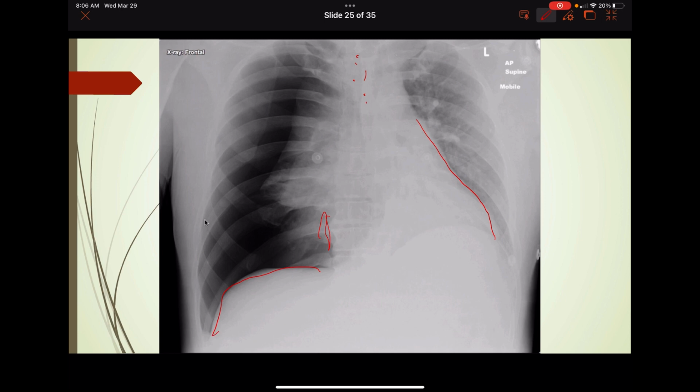Diaphragms, and you can see this deep sulcus sign again, telling you there's pneumothorax. But even without that, when you look at everything else, you can see that there's no lung markings in here at all, just at a glance. You can see the pleura right here. That's lung.